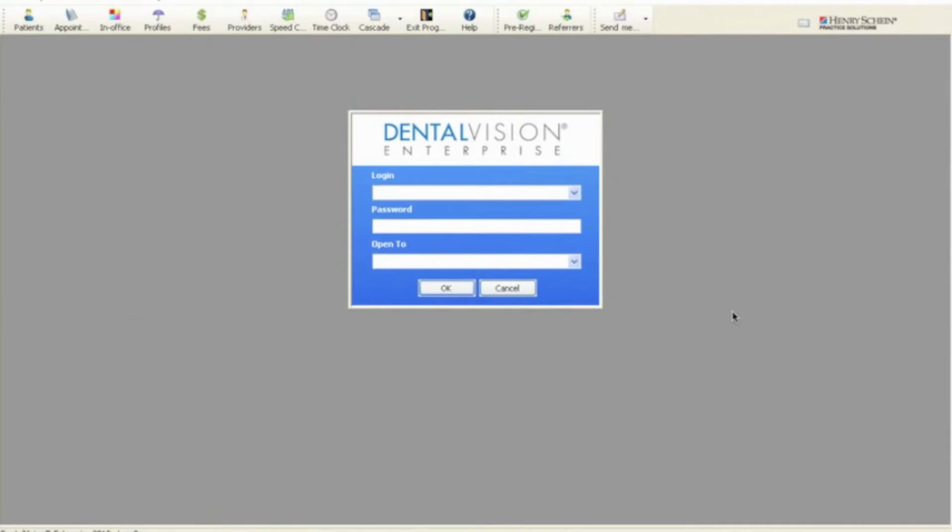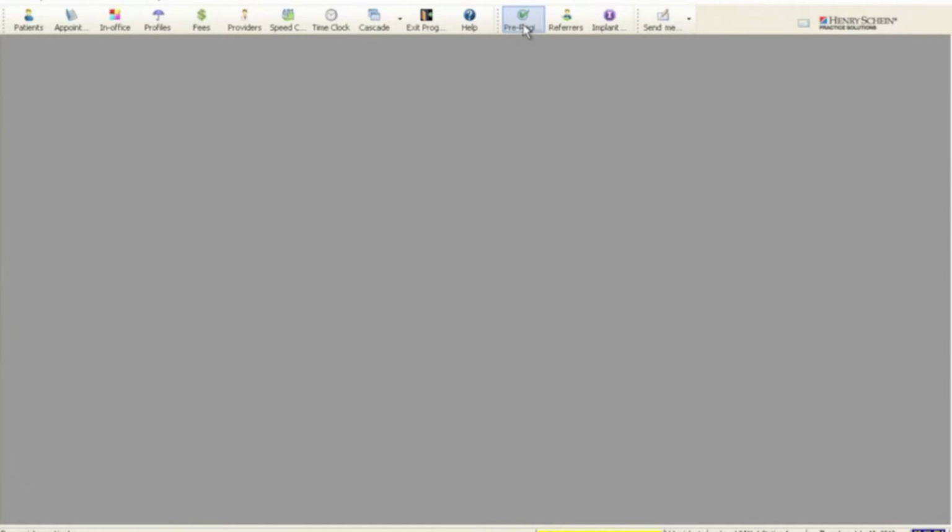And today we will be giving you an overview of the changes you will see in our 2013 update. The first change you're going to notice is the login screens and splash screens when you log in. We're going to start with the pre-registration changes.